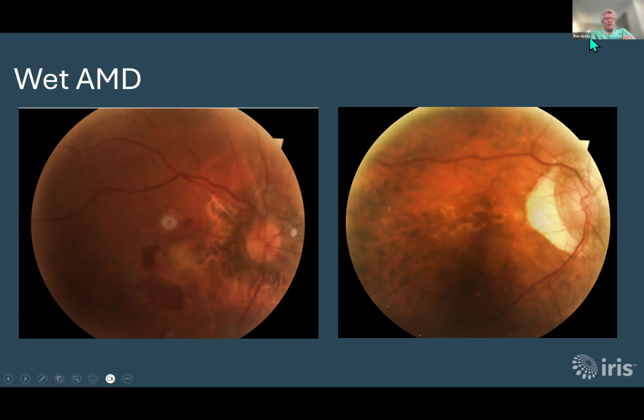So again, as long as we're there when we see blood, and sometimes it's just scar tissue. By the time it's scar tissue, it's too late. But if we can see fresh blood under those circumstances, we really can intervene and make a substantial improvement in their vision. So again, as long as we have the picture, we might as well make the greatest benefit from it. Next.